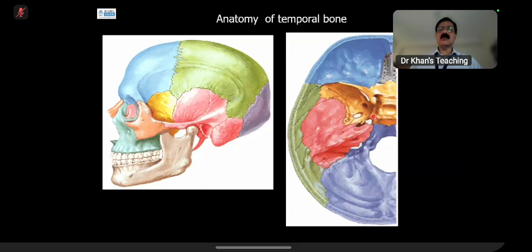And this is the cavernous portion. So if you see, this is the pituitary fossa. You can well imagine that from here to here will be the cavernous sinus. And you can see that the petrous apex, which is this one, and I'll show you cases today about petrous apex, which are exam cases, is sitting so close to the cavernous sinus here. So coming back to the carotid artery, it passes through it, then through the cavernous sinus, and then there is a supraclinoid portion.